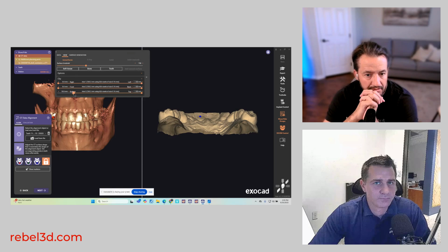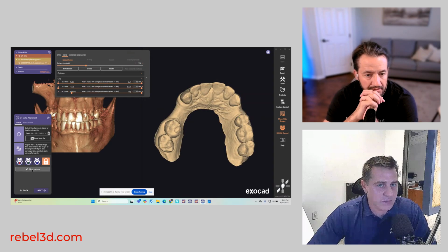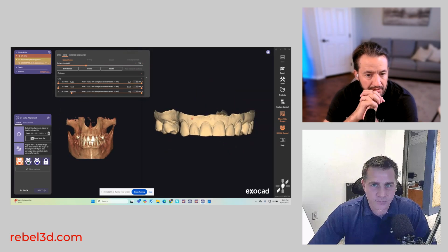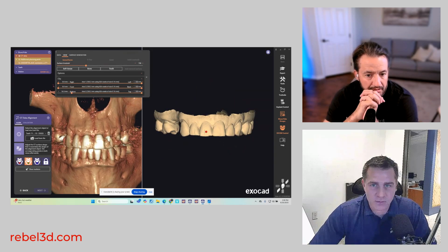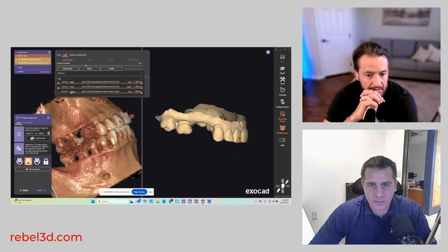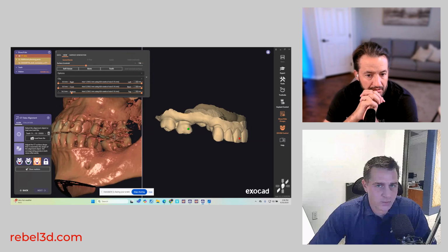Let's do it a different way this time. Let's clear all the markers. Let's just mark the facial, and then try that.